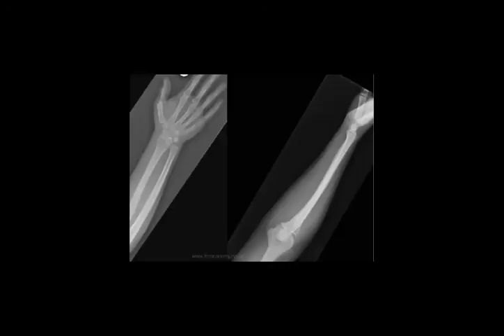Time to shift to rapid reporting. I hope you will enjoy it. Are you ready, our stars, to see who will catch the abnormality easily? Let's train together in this. Okay. Let's play for fun. We'll try to make it easy.